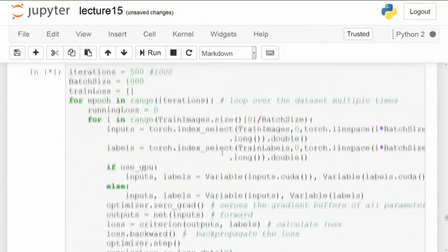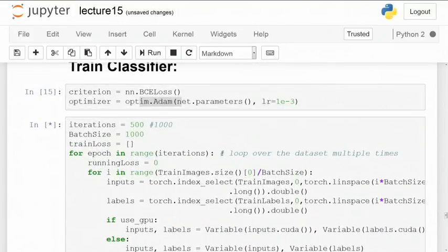What you need to keep in mind is that while in your earlier examples where you had the classification with MNIST, or you had to classify just those white blood cells into whether they are leukemic or non-leukemic, you were going to have one label associated with one single patch of an image. Here it is sort of a series of labels associated with every single pixel within the image, and that is what is changing over there.